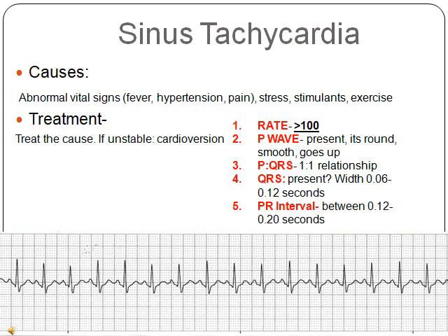Sinus tachycardia. So this is the opposite of sinus bradycardia. By the name, we see that it's just a fast heartbeat. 2, 3, 4, 5 are all normal, and the only thing that's abnormal is the rate. The rate's going to be faster than a normal rate. A normal rate's 60 to 100, the rate's going to be more than 100. And as we could see, there are much more than 10 R's. You don't even have to count that to see that.